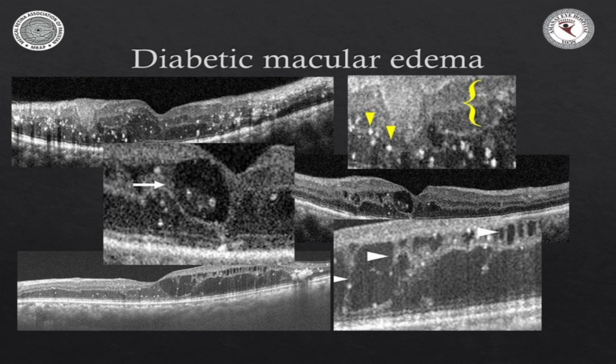यहाँ पे आपको एक terminology जिसको we like to give fancy name to things, disorganization of the retinal inner layers. You see that the retinal inner layers are all fuzzy and indistinct. This is a sign of inner macular ischemia. So when you've got a clear-cut OCT like here with well-defined inner layers, you know that this patient is going to respond better to your anti-VEGF.